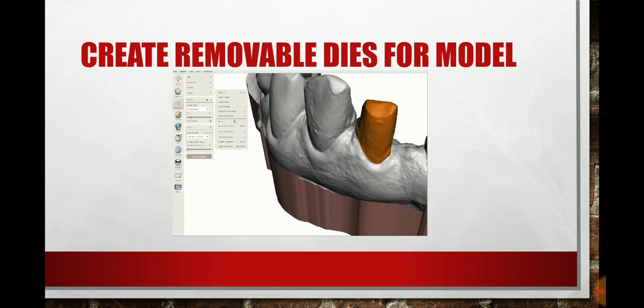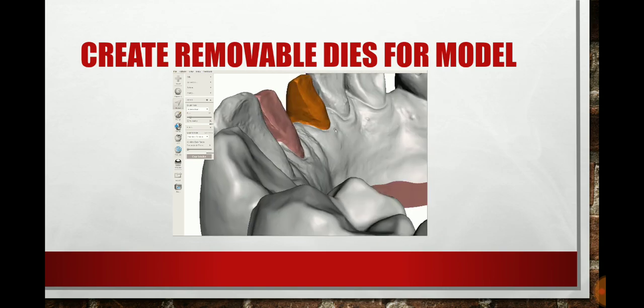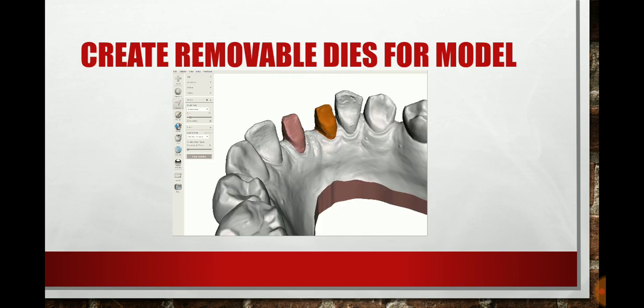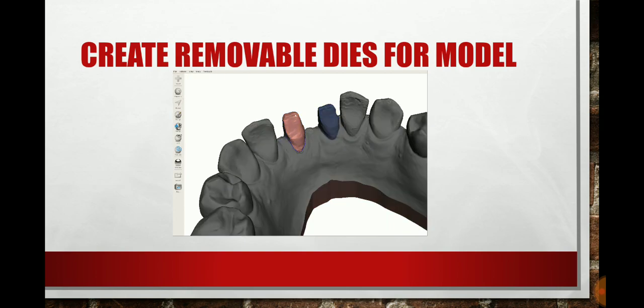Then we're going to go ahead and smooth the boundaries, or optimize and smooth those boundaries. You'll see exactly what it does, and then it should create another face group on this one as well. After you're done here, you can see it. It's actually pretty cool. You can select the tooth, and then you can separate that tooth from that prep from the model. And then you want to do the same thing for the opposite side.